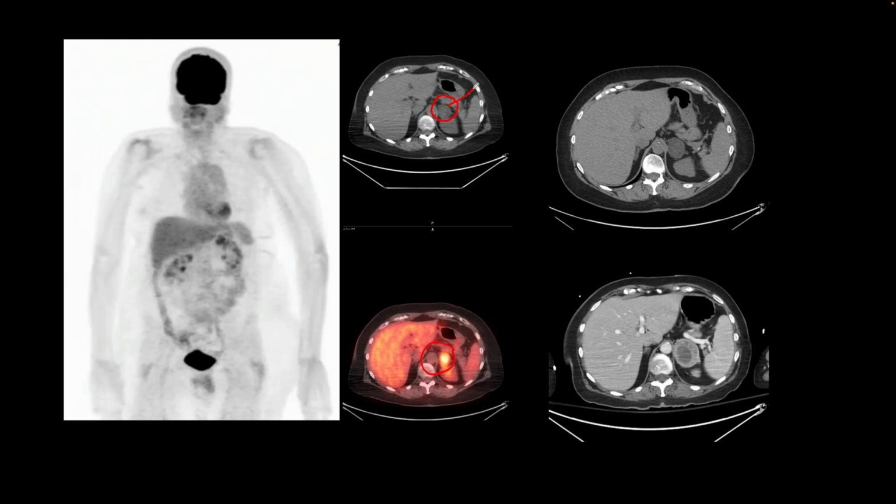So this was called a benign adenoma, and about 8 years later, the patient presents again for a CT scan, and on the follow-up CT scan, we find that the adrenal adenoma is larger, and because this was performed with contrast for another indication, we do see some contrast enhancement peripherally and some central non-enhancement or necrosis.